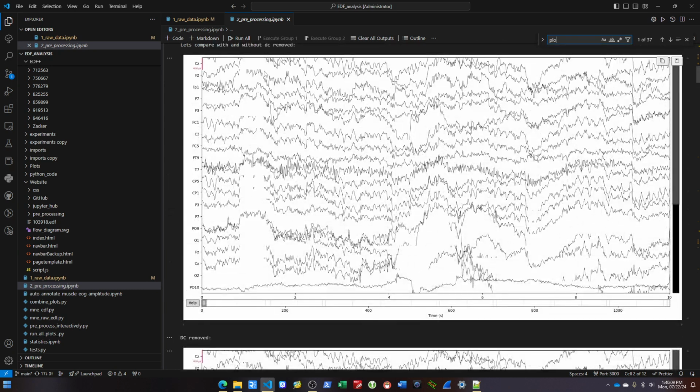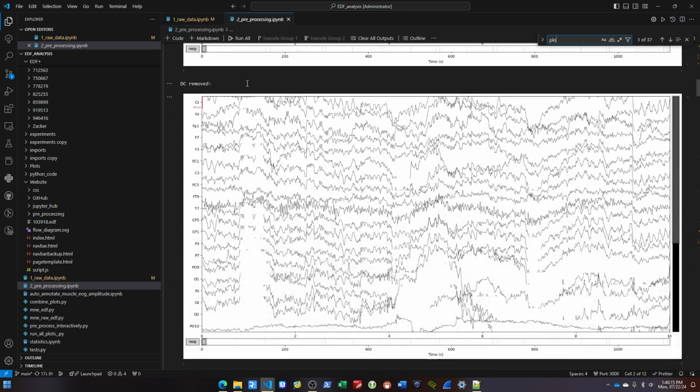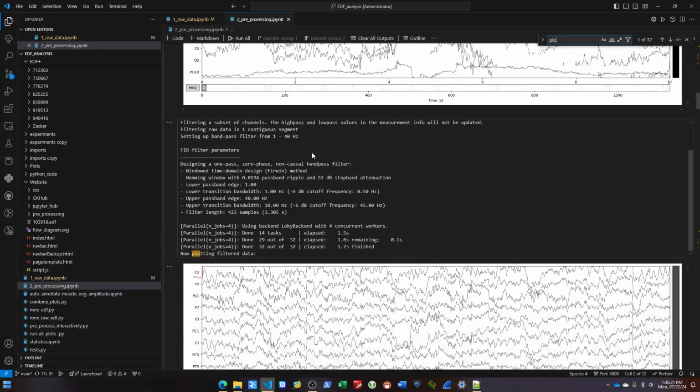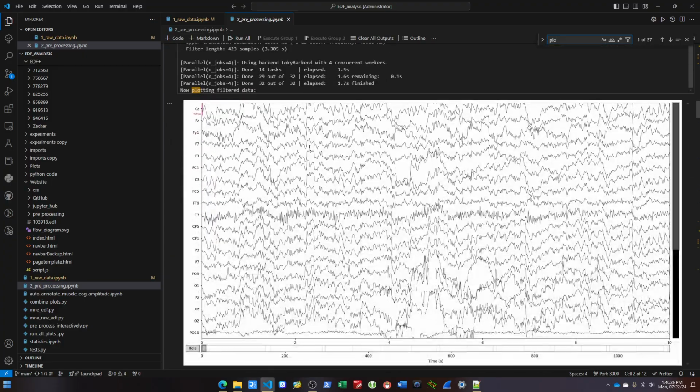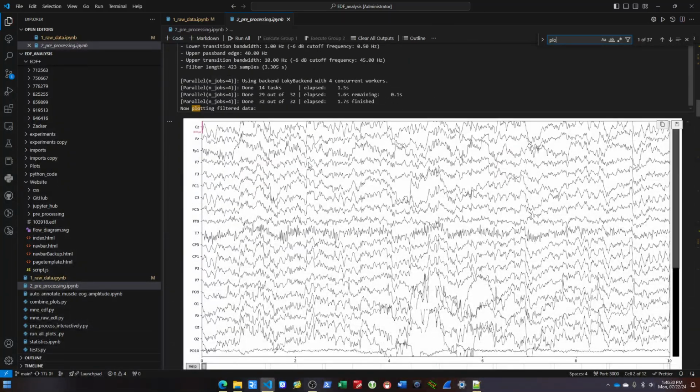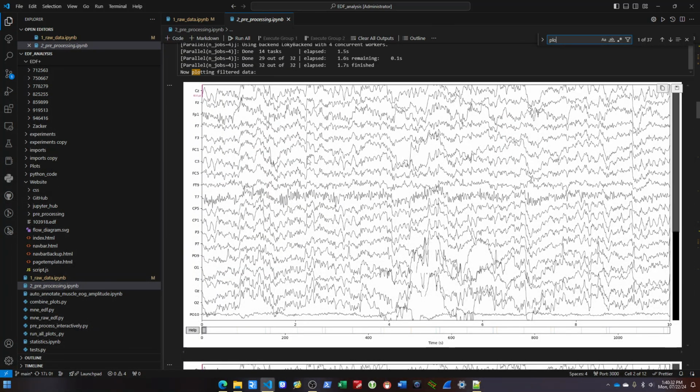This was the previous one. You could see we have all these up above the graph here, all over here. So let's scroll down at this same area. And you can see getting a lot more on the graph, right? It's a little improved in that area. So now let's see what we can do with even more filtered data. No, this is the filtered data, sorry. The previous data had DC removed.